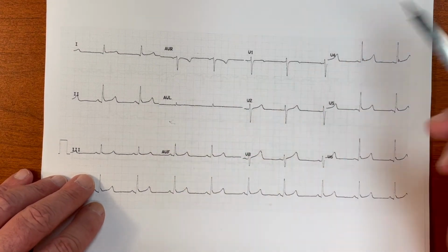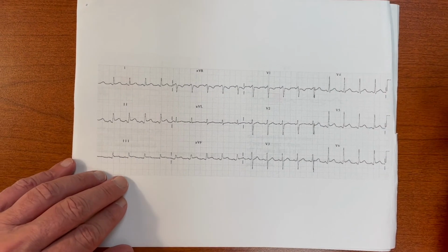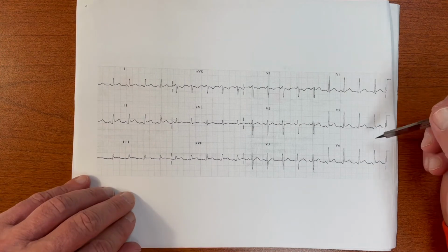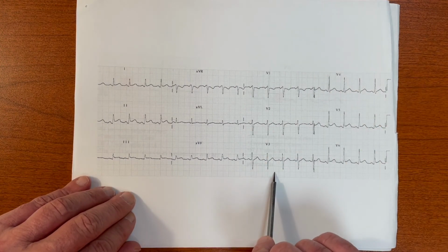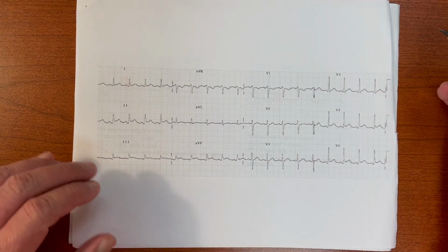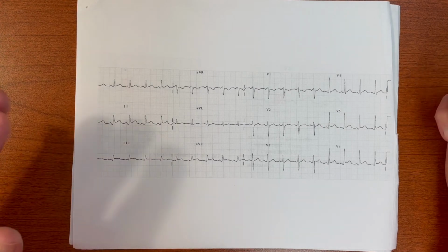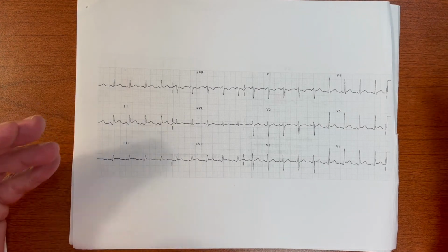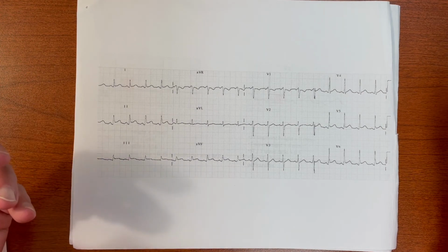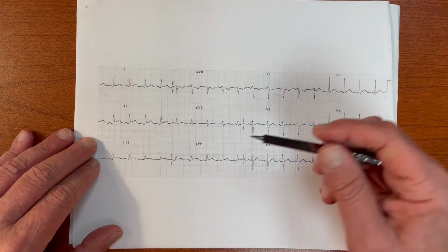Now, the hallmark of the next diagnosis would be PR segment depression. Here, the chief complaint is also chest pain. Here, we notice that the patient is tachycardic. It gives you an idea that something might be wrong. Based on the history, we get the history that perhaps it was positional. The patient gets relief with sitting forward, and the kind of pain was sharp and made worse with breathing. It makes us think pericarditis, so we're going to look for pericarditis.